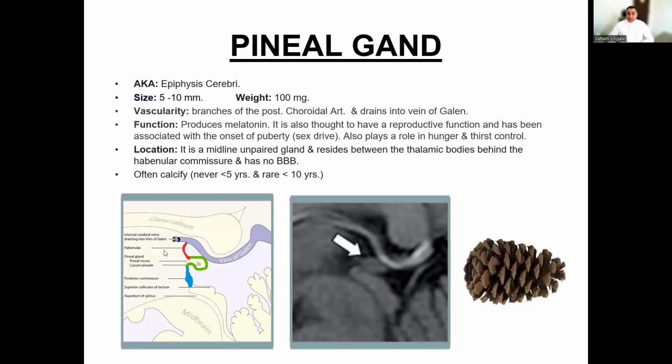It is rarely found to be calcified below the age of 10 and almost never calcifies before the age of 5. It lacks a blood-brain barrier, and hence its enhancement after contrast administration.